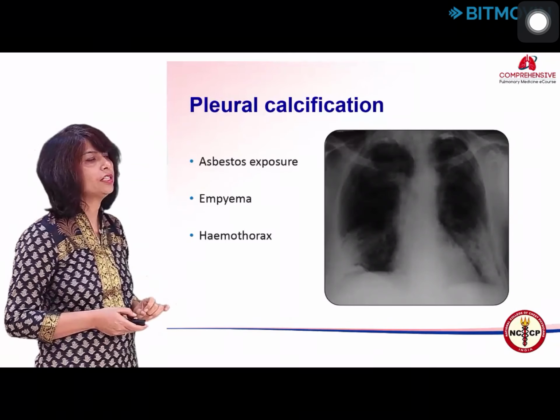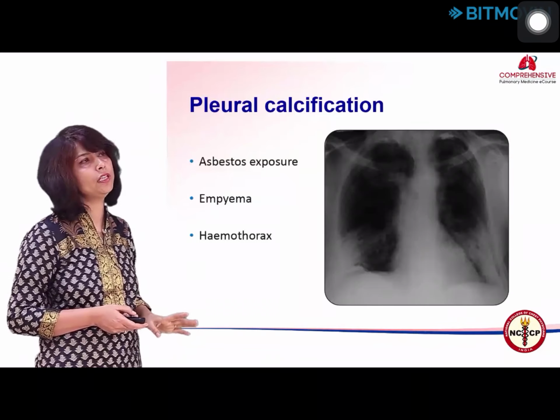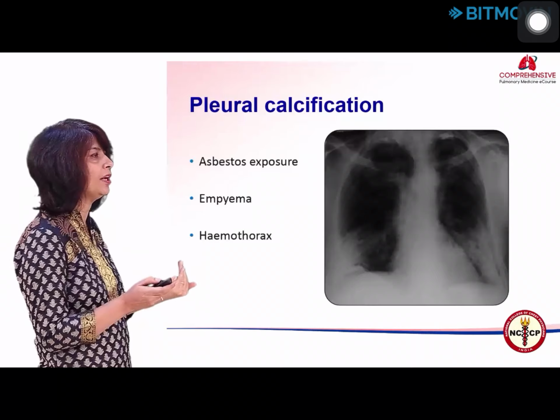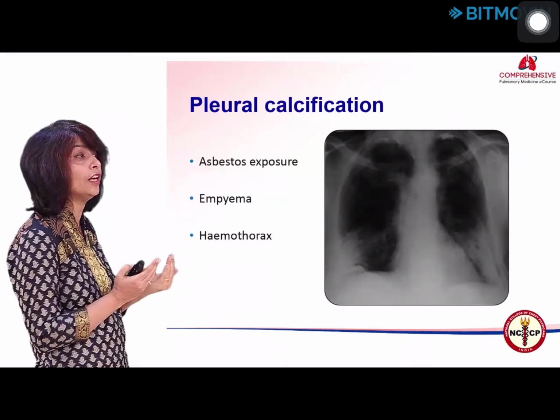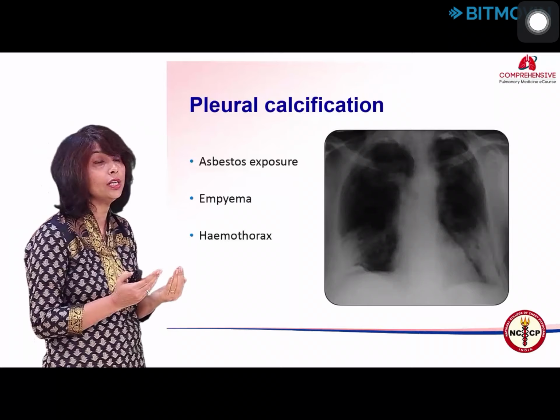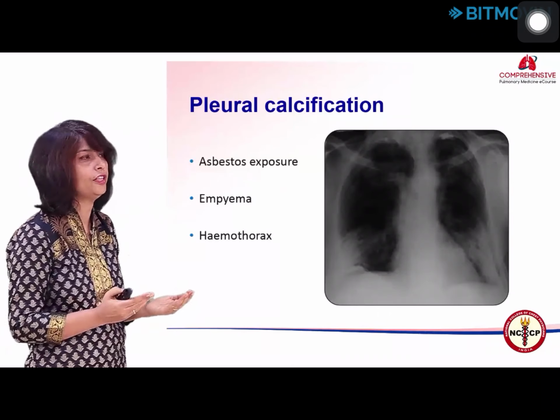Pleural calcification, very important to recognize because it is very often missed on frontal radiographs. You see what it looks like? It's not peripheral, it's covering up the whole lower zones. Because you have taken a frontal radiograph, it's covering up the whole lower zones, but still I'm telling you, nothing of this entire lesion is in the lung parenchyma. All of it is in the pleura.